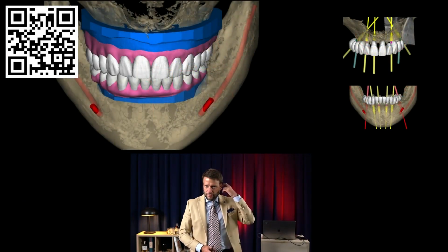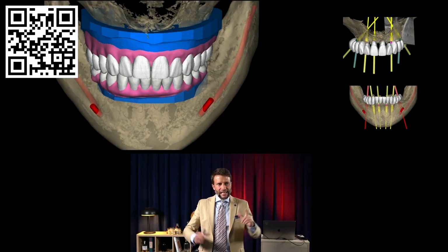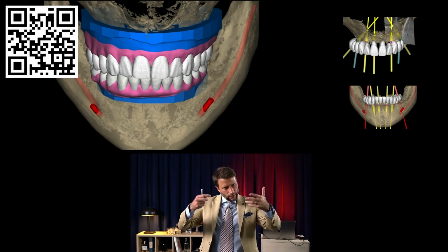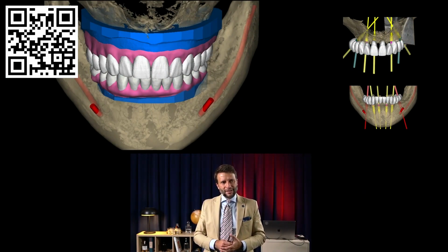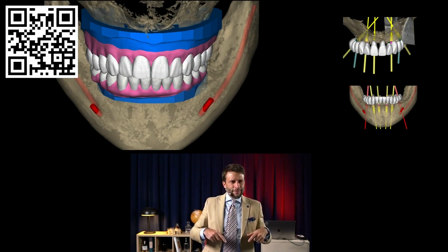So now you have the new upper and lower, still facially driven, a little bit longer than we planned initially, preserving much more bone, simplifying the surgery.